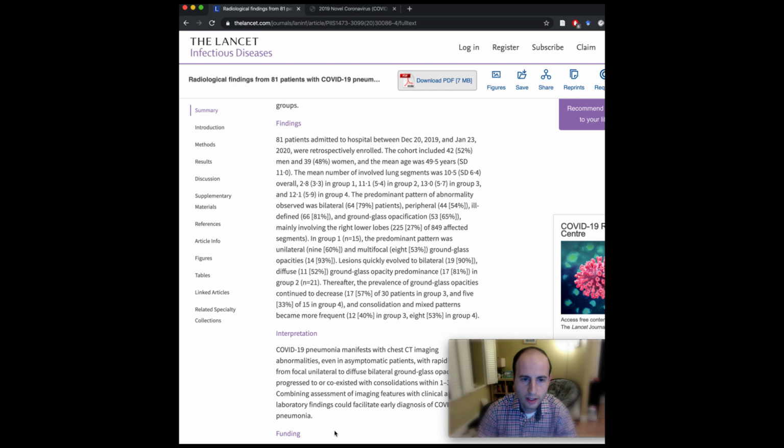And it's really important that we don't forget our differential diagnosis for all of these appearances, because patients, even in the age of COVID, and even in areas experiencing epidemics of COVID, may still have other diseases, including pulmonary edema, alveolar hemorrhage and organizing pneumonia. So it's important to keep a broad differential, particularly if you don't know if the patient has a COVID infection.